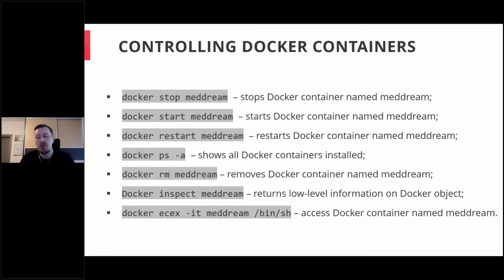And if we talk about the commands after installing the Docker containers, of course, the commands to start, stop, and restart. The three commands here are the most common you will use. You might also need a command to see what Docker containers you have installed. So with docker ps -a, you can see all the Docker containers which are installed, whether they are running or stopped, you will see the whole list.